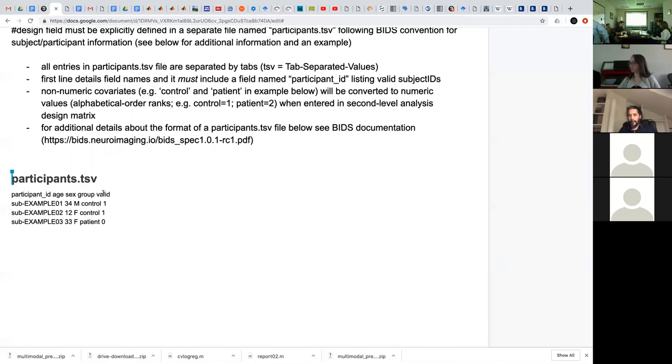I got this to run yesterday, and there's one subject that I included in all the first level analyses, but I said no, I don't want them. There's weird stuff going on, so I just put NA in. Right, that makes sense. Yep.